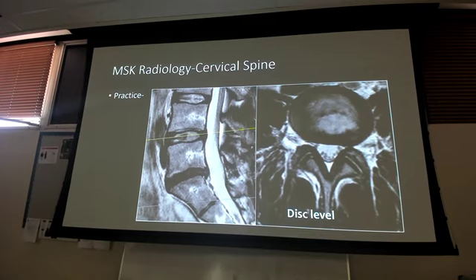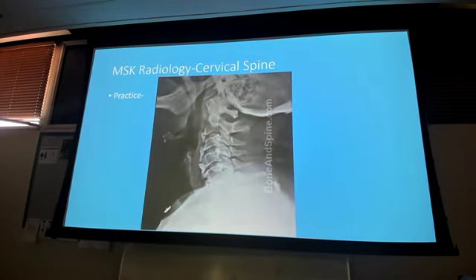You guys won't have to pull that out. Radiologists will do that. But does everybody see the L4, L5 bulge sitting right in there where the yellow line is? It's subtle, but if I follow it all the way down, I can see that bulge sitting there. All right. That's just a really bad picture of those anterior osteophytes in the cervical spine.